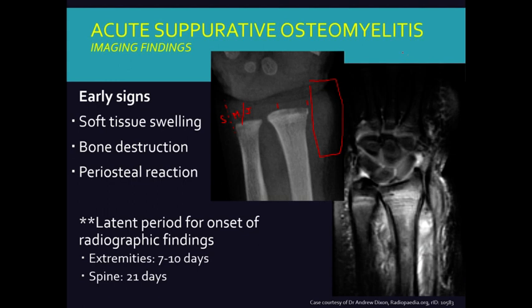So this is some sort of fat suppressed image, so they've reduced the fat signal, and it's more T2 or STIR. So it's much better at showing inflammatory change in water densities. So all the white stuff you see here, that's all water density and/or inflammation. Inflammation in this case because it's infection.